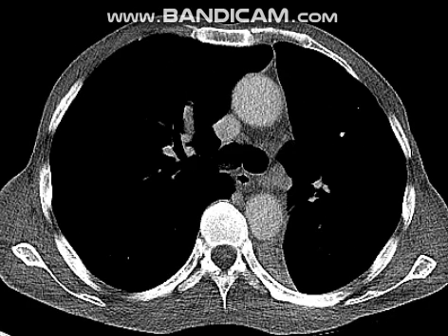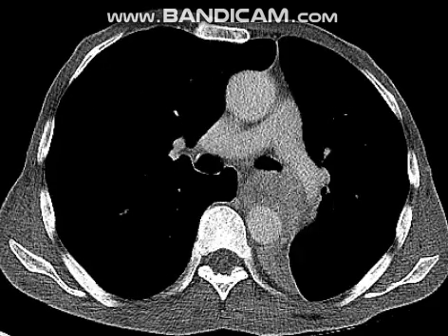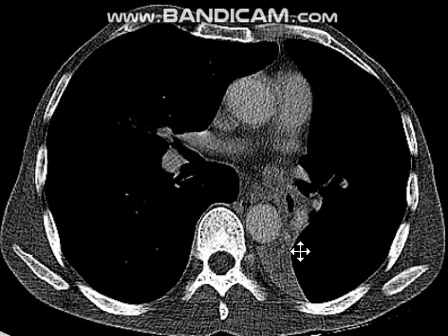So as you can see here, this is the left mainstem bronchus and this is the inferior division of the left upper lobe bronchus. And after this branch, the left lower lobe bronchus should be given here, but it's now compressed by a bulky mass at the level of the hilum. Okay, so here the left lower lobe bronchus is compressed by a bulky mass at the level of the hilum. I think this is the cause of the collapse of the basal segments of the left lower lung lobe.